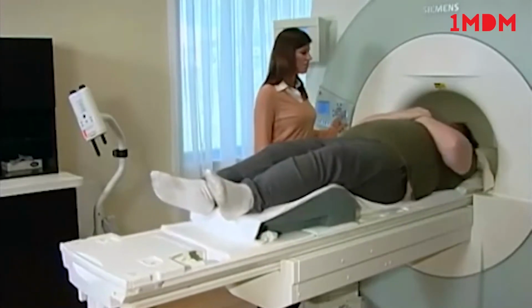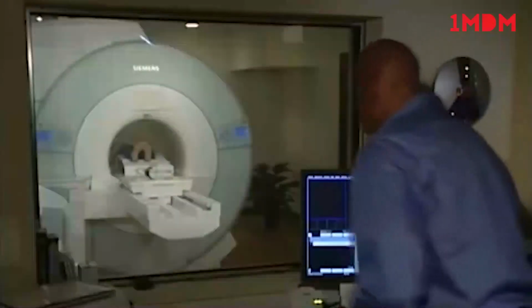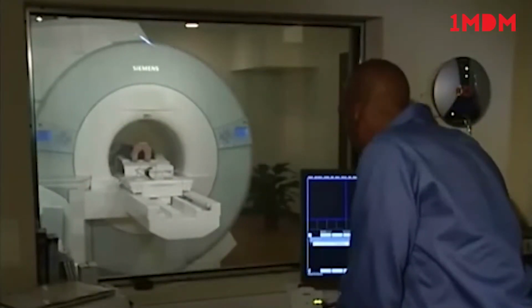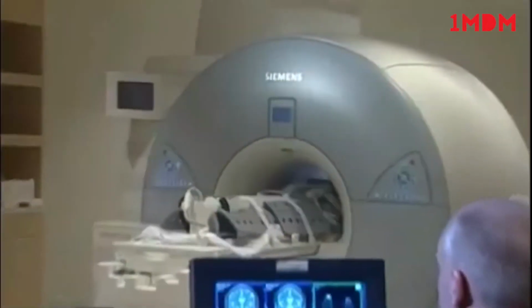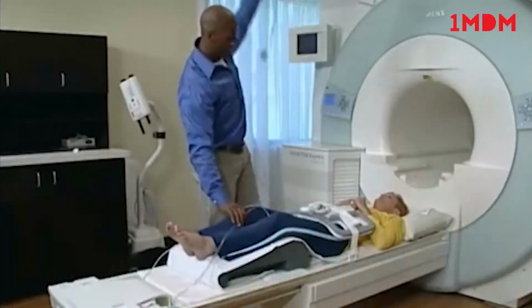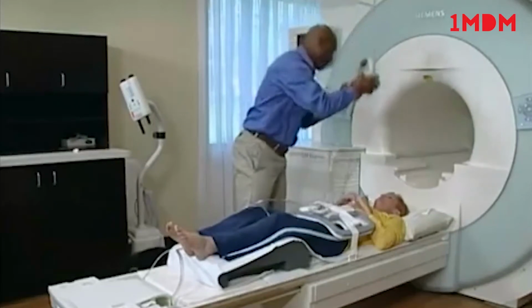Since the coils generating the gradient field are located in the static magnetic field, a sudden force is exerted on them when the current is switched on or off. The noise increases with the strength of the static magnetic field and the gradient fields. Siemens MR scanners are equipped with audio comfort features, which reduce the noise levels typical of other scanners. However, it's always good practice to wear hearing protection.